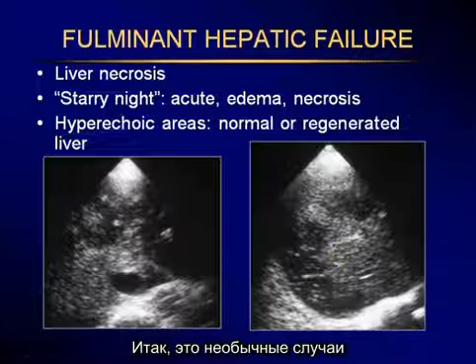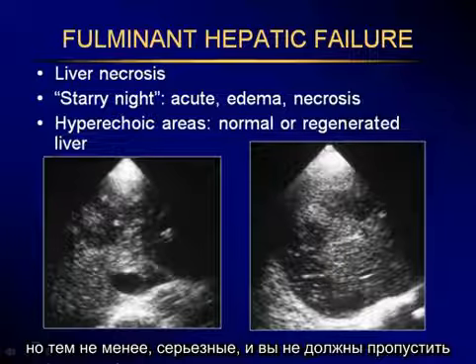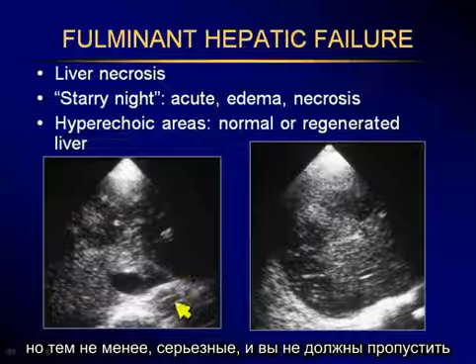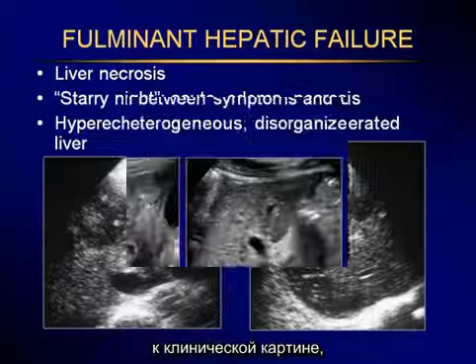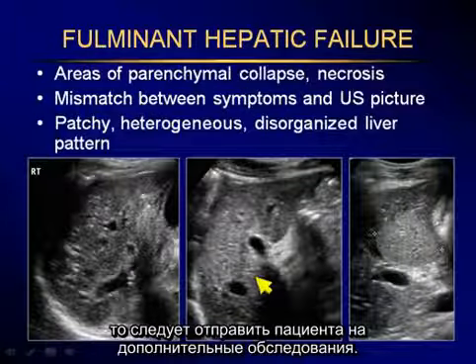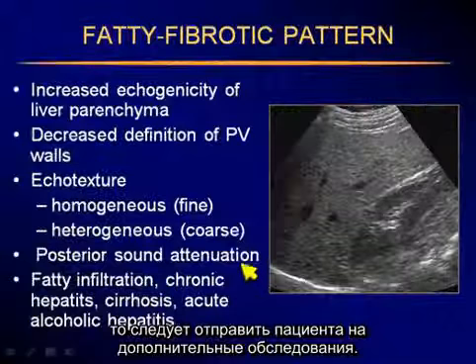So these are unusual cases, nonetheless serious, and we should not dismiss such an appearance. If you're not sure, if it doesn't look like it matches the clinical picture, we should send the patient right away for evaluation.